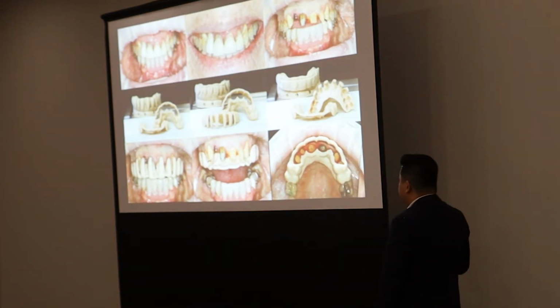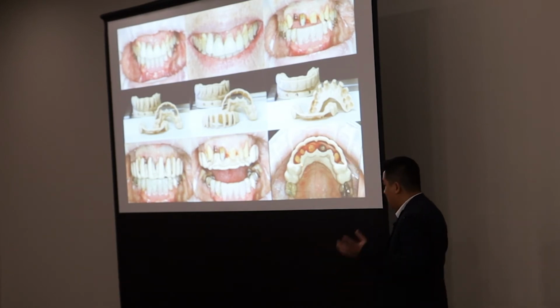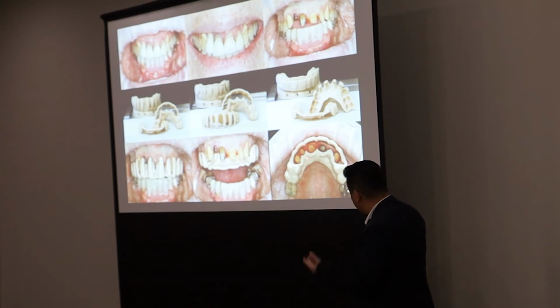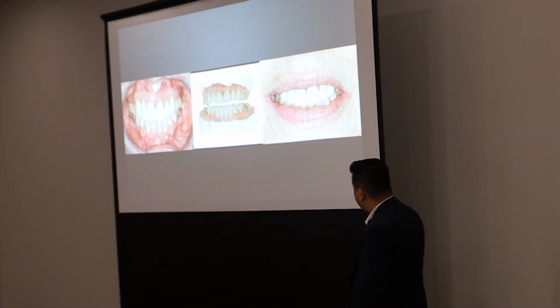Once we do that, the patient went through the crown lengthening process, and they healed up really nicely. So again, I take my design, bring it back into the dental system, and make prep guides. These are 3D printed preparation guides that we make for the doctor. You can use these to check all these. And again, I'm just copying and pasting my previous design, and I look like a superstar to the doctor. His job becomes a lot easier. I get a lot of nice interproximal clearance, incisal, everything like that. And of course, we have our final result, which is very close to what we had initially determined.